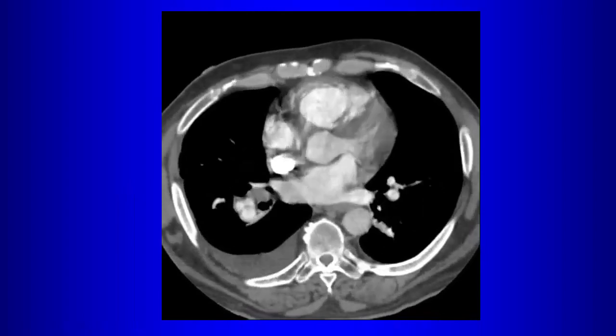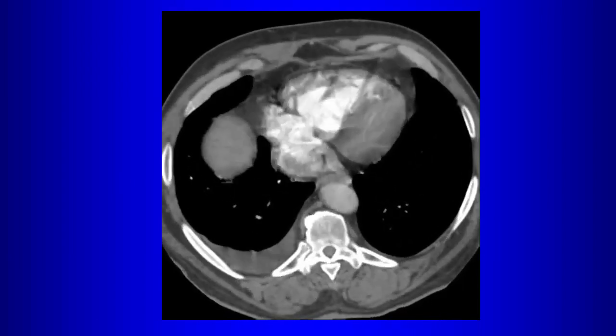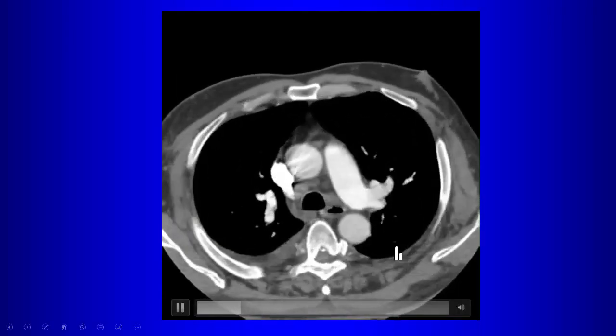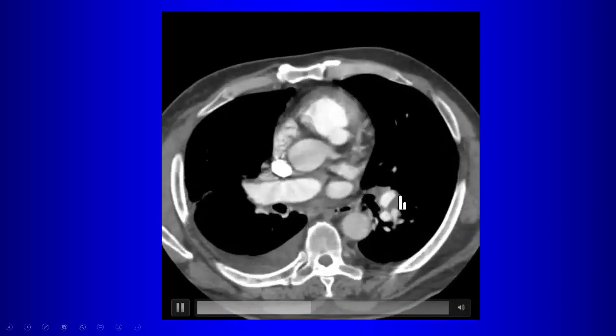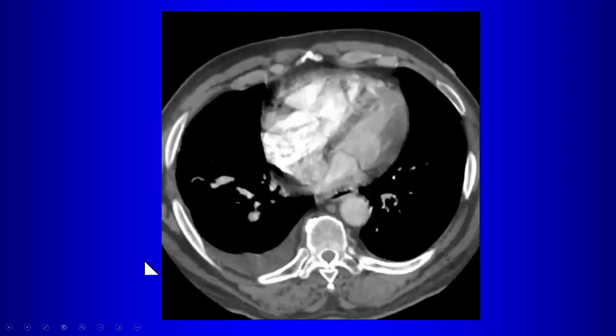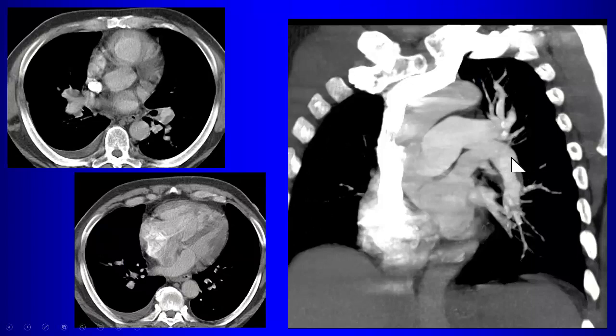So where do you see the chronic PE and how do you know it's chronic PE? Yeah, so the filling defects, there are filling defects here as we come down the left, but it's peripheral, it's eccentric. There's an eccentric one also here on the right. There are filling defects within those lower lobe vessels, but they're eccentric filling defects, okay? And again, the reformatted views can be very helpful, showing you this eccentric filling defect here in the interlobar, and also some eccentric filling defects on the right side. So this is chronic pulmonary embolism, which has led to pulmonary hypertension in this patient, right?